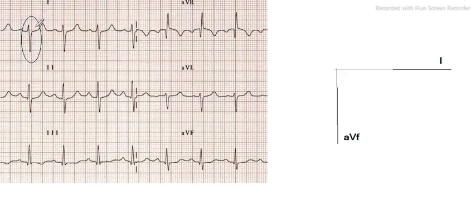In the QRS complex you see that there is slight positive deflection. However, there is greater magnitude of negative deflection. So the resultant vector will be negative. When you draw this vector in lead 1, it will be in the negative direction. What I mean to say is that the vector will be moving in this direction. So this is the vectorial representation of QRS depolarization in lead 1.